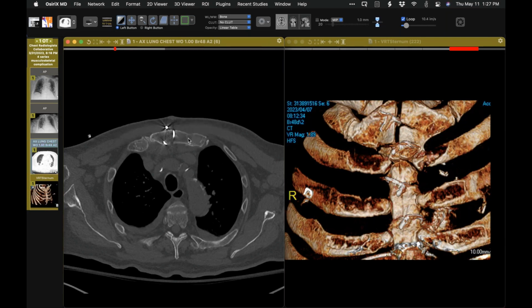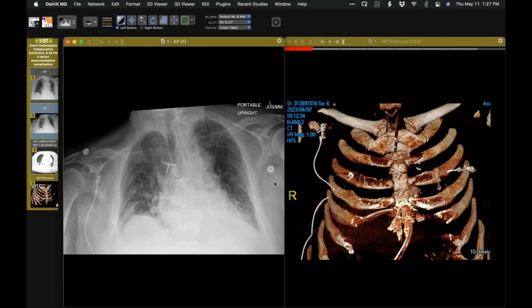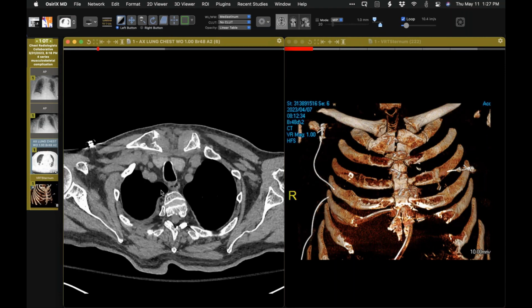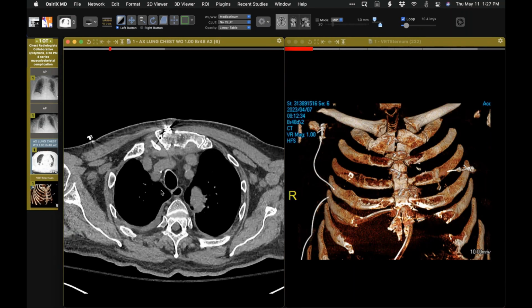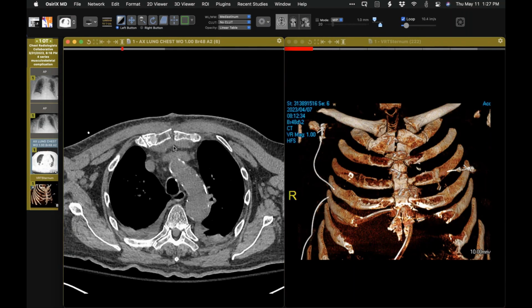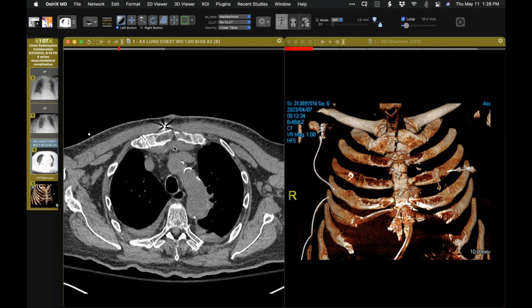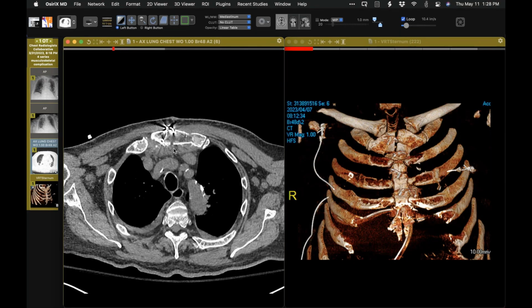It's on the early end of what you would expect from mediastinitis and dehiscence. It's probably just a sterile separation. Yeah, so that's what we think, it just pulled through. Exactly. Let's go back to the CT and look at the mediastinal windows under that region. There's nothing else under there to suggest more than just a tear through, I think.